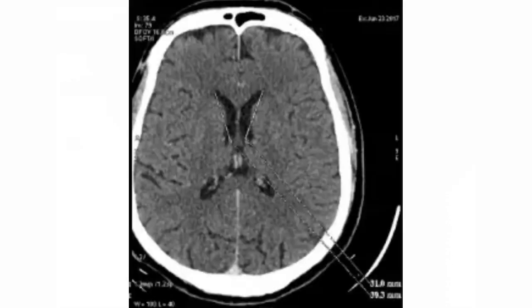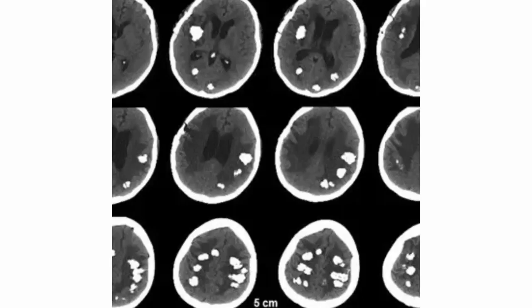Next is the extent of the imaging. The imaging can be a single slice, like at the level of the lateral ventricle, or the image can be of multiple slices starting from the vertex to the base of skull, or can be only the base of skull. So as the images show, you will describe accordingly. Like, it is a CT brain without contrast, axial view with multiple slices showing from vertex to base of skull.